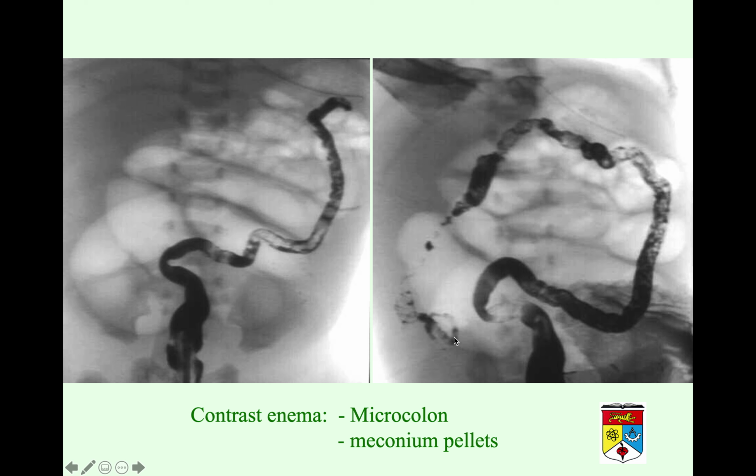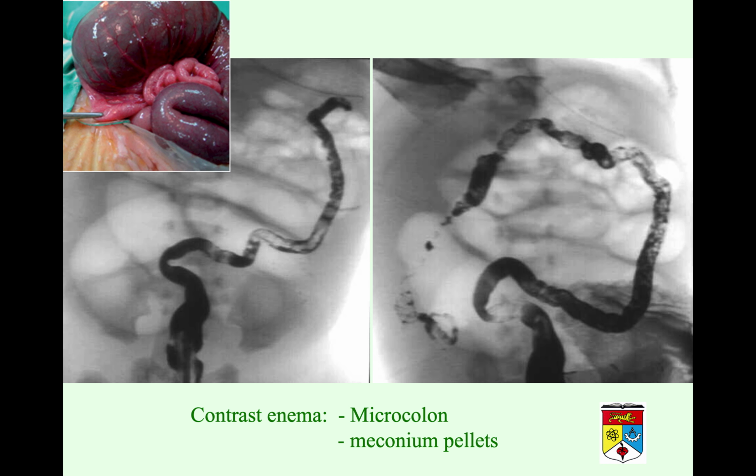So this is a characteristic finding of low bowel obstruction in cases of meconium ileus and also ileal atresia. Intraoperatively, definitely you will see that the more proximal bowel is so dilated, it looks as if it's almost gangrenous because there's some blood compromise, but the more distal one is collapsed, just because there's an atresia in between.